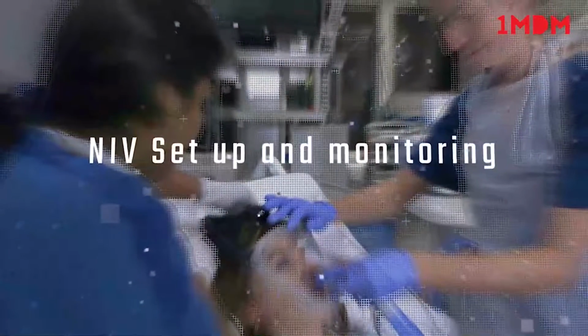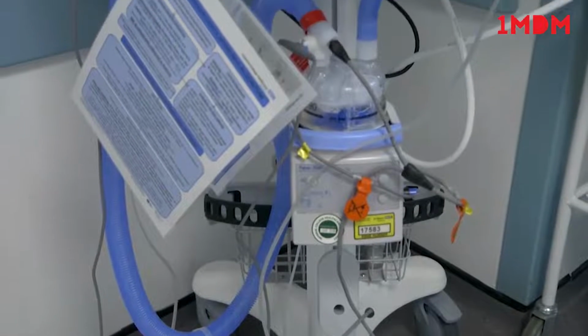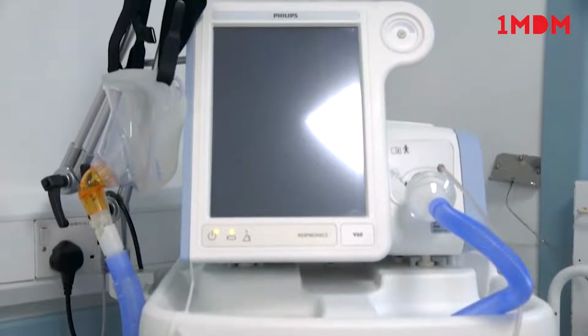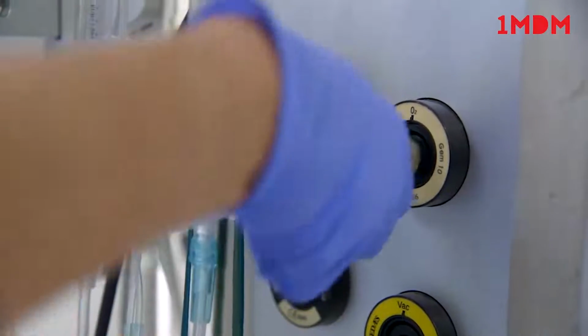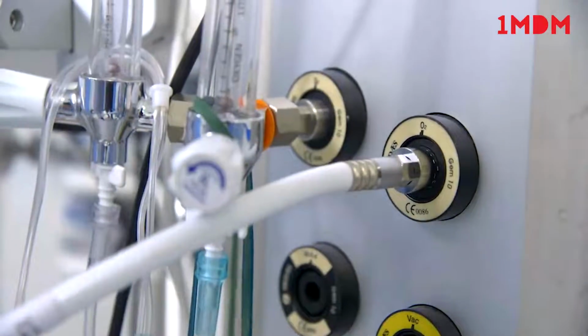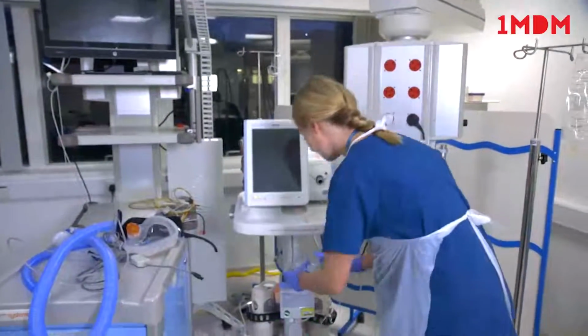NIV should be set up by a competent practitioner. Before setting up, ensure all equipment is available, including a humidified circuit, different size masks, and a humidifier box. Plug the V60 in and connect to the wall oxygen. Connect the circuit with pressure line to the ventilator, ensuring there is a bacterial filter within the circuit.